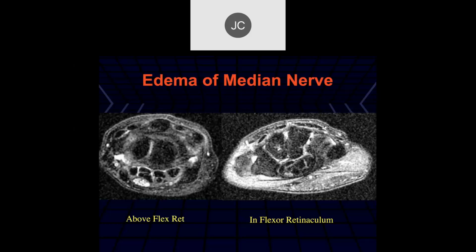In cases of carpal tunnel syndrome, if you have increased pressure, you can get a decrease in the cross-sectional area of the median nerve in the carpal tunnel, and widening of the median nerve, both proximally and distal. That's called an hourglass appearance to the median nerve, as you would see it if you decompress this area surgically. And when you get that with carpal tunnel disease, often you'll get an increased fluid within the proximal and distal nerves.